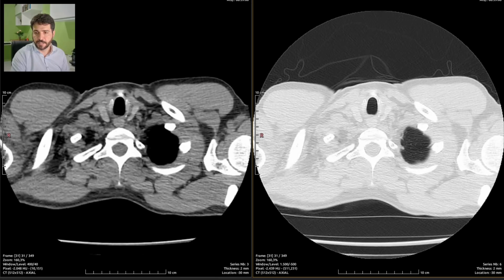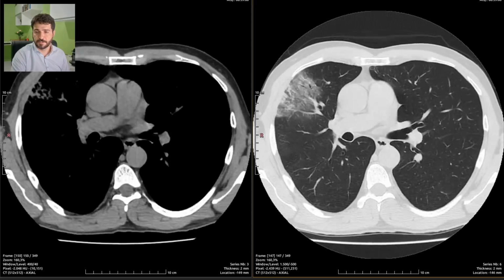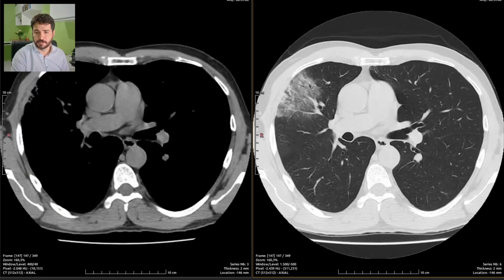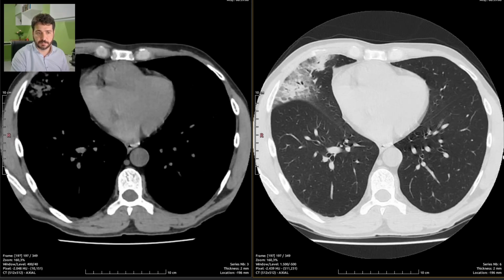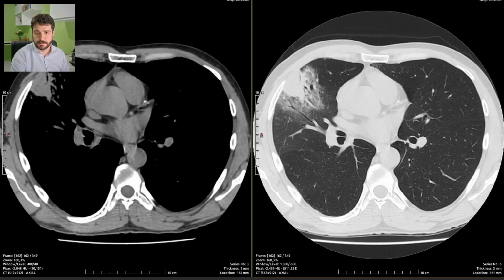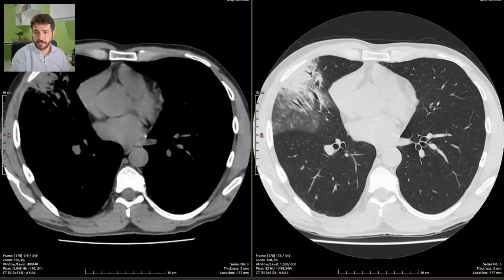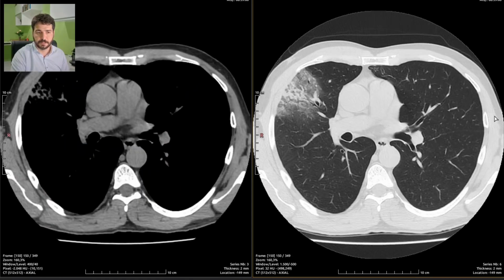to be suspected if this patient has clinical features of pneumonia. Pneumonia is much more common, makes much more sense. So this is pre-contrast. This is what the patient has. This is a single area affected by this one consolidation and opacities.